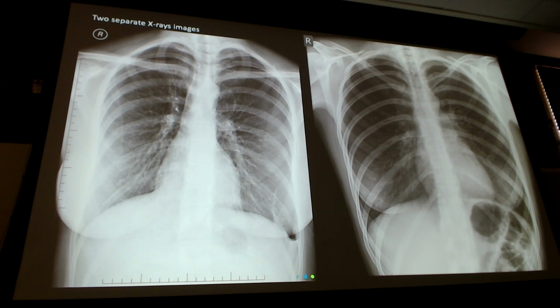But then when I trace my scapula down and come around, I've got this extra little superimposition line that goes along with my scapula in the medial border, up and down, superimposed on that rib there. Right? So she did a much better job of bringing her shoulders forward to get those out of there, but those are your ways to determine between a pneumothoracic line or a scapular line. Trace, then look for lung markings. That's the order I would do it in.